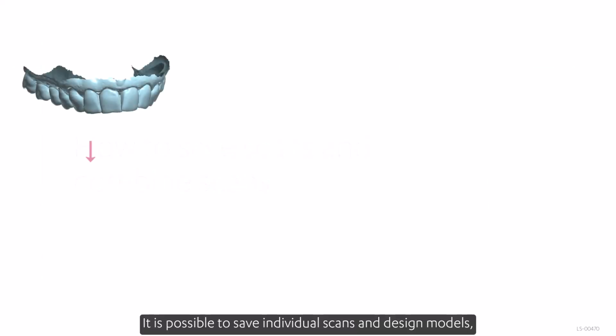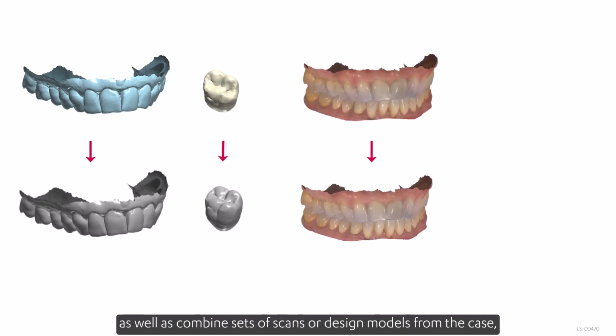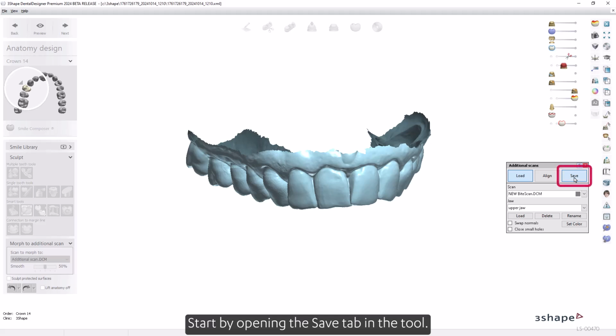It is possible to save individual scans and design models, as well as combine sets of scans or design models from the case using the Additional Scan tool. Start by opening the Save tab in the tool.